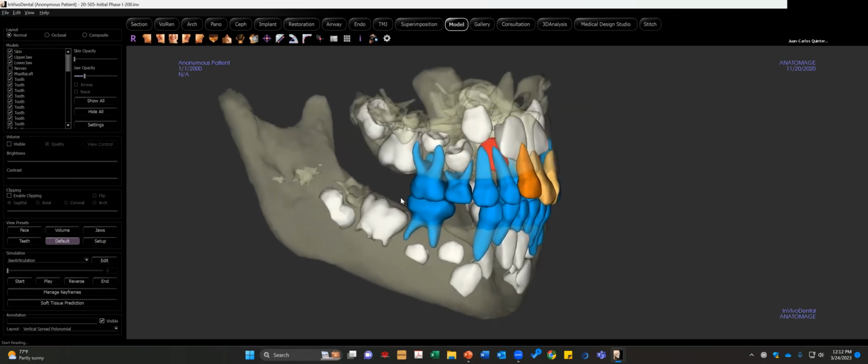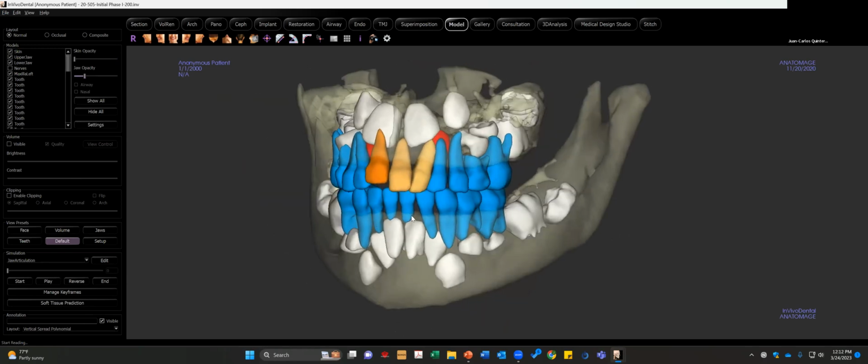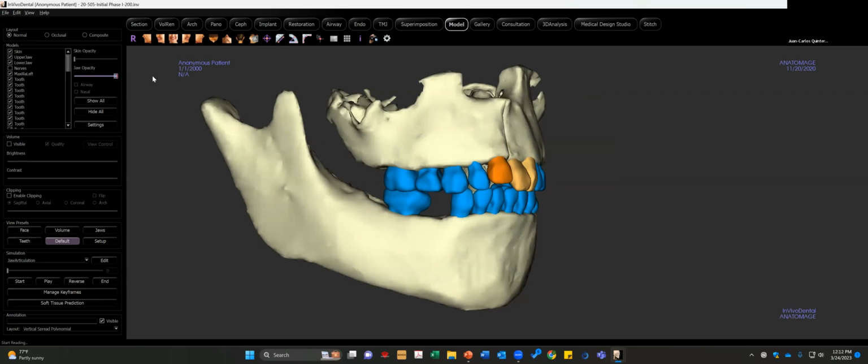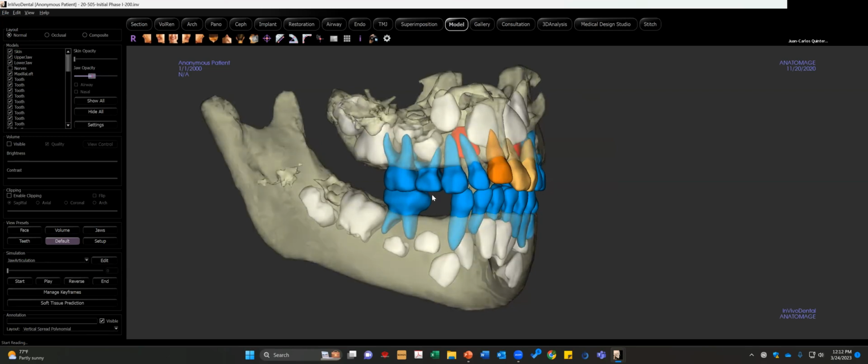So some of the great advantages here are, why is it functional? Well, number one, you can move it. Secondly, you can interact with the data. That means that we can increase the opacity, decrease the opacity. Thirdly, we can color certain elements, and that is great for presentations and understanding. And we're going to talk about that further down the road.